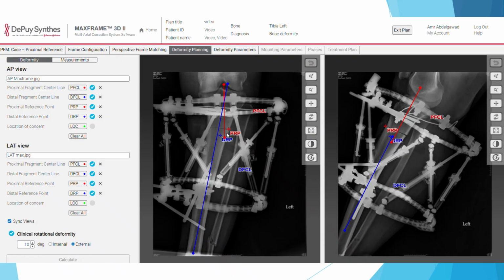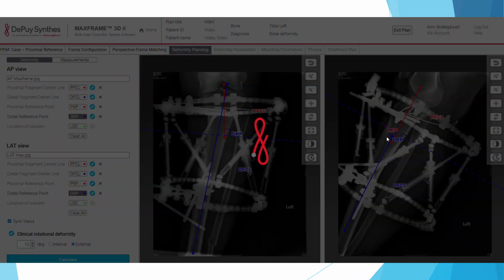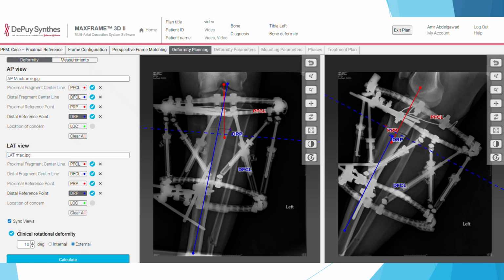Now let's go into more depth, and because this is not just only to describe this point, I want you to understand how to use it. So let's say that you pick this number here, and then you pick this here, and both are there in this here. So you see this will definitely cause an issue here, so you need to bring here, and we can move it between 2 sides because we have the sync. But if we don't have the sync, you'll have to come here and click here, which is okay. Just I want you to understand every click here.